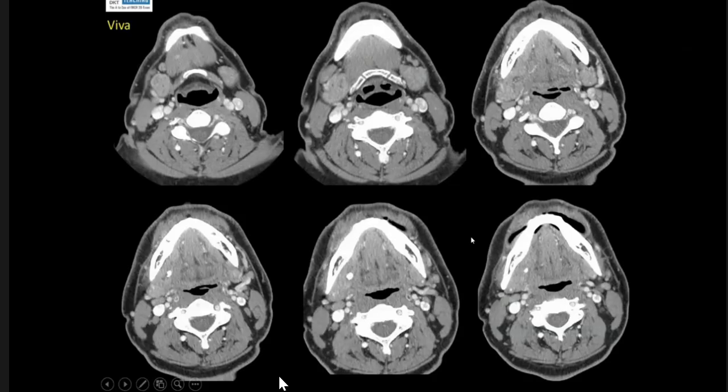I'm looking for the submandibular duct. Yeah, I can see a hyperdense lesion in the vicinity, likely representing a stone, which is going within this one, yes. So likely representing an obstruction within the submandibular duct, which is causing inflammation in the submandibular gland on the right side.